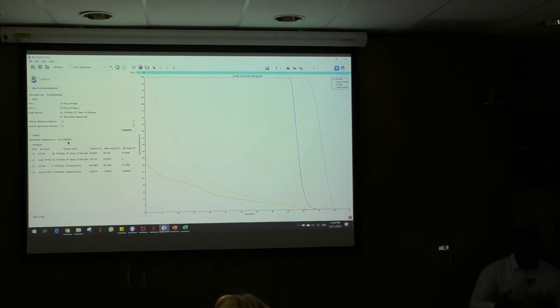I haven't figured out an application for that yet. So in terms of the radiotherapy extension, this is the full capacity of Slicer.